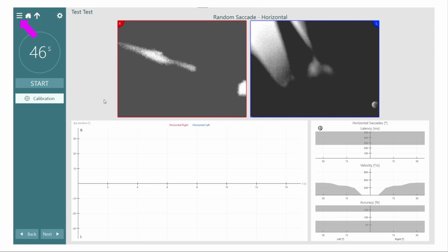And then this other icon right beside it, I call it the hamburger icon. It's got 3 lines. So you got your top bun, bottom bun, and meat or whatever in the middle. And so I call that the hamburger. So if you hear me say that, that's the icon I'm talking about.